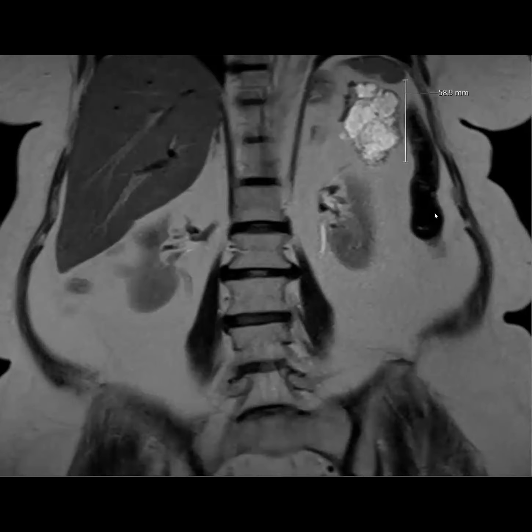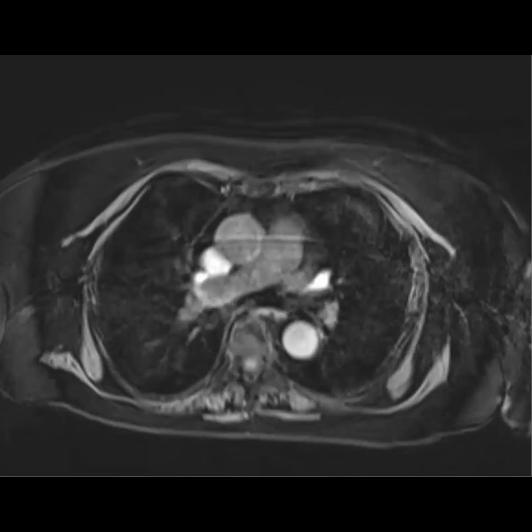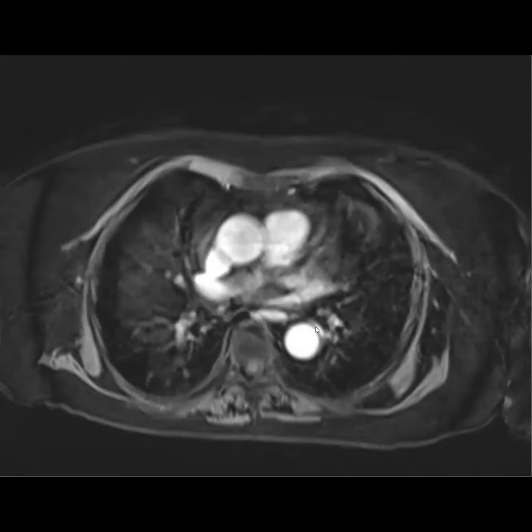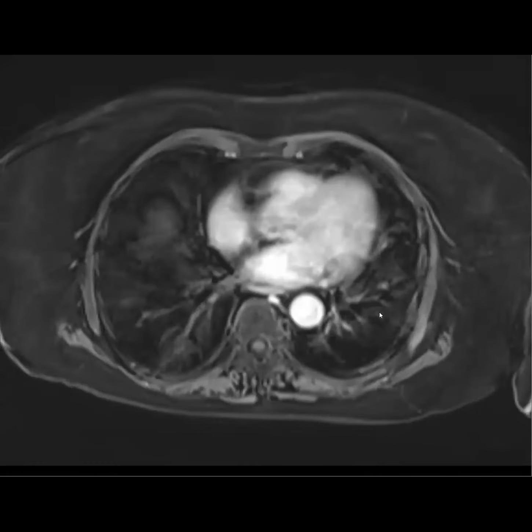With a lobulated border, multiple septations. And this is where I think it can be tricky on CT. So if anything ever looks cystic, just keep it in the back of your mind. Is there any possibility this could be a serous cystadenoma? And if you even think that at all, recommend an MRI.